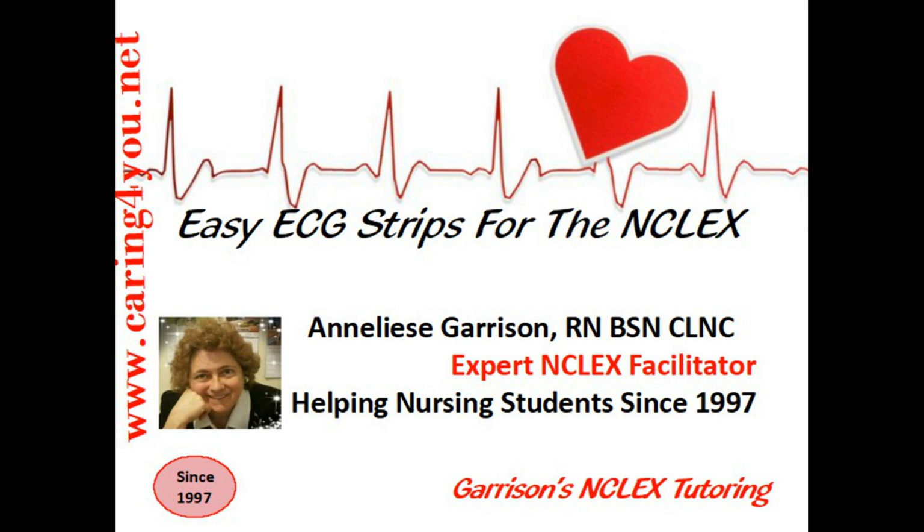We have been reading ECG strips since 1888 is when it first started, and then it gained a little more popularity in 1903. So reading the ECG strip still remains the same, and that is what I am presenting to you today.